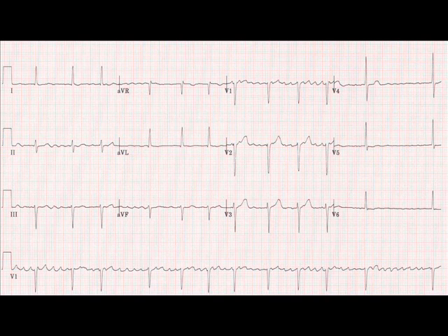And remember, if they're in sinus rhythm in one lead, they'll be in sinus rhythm across the rest of the recording. Well, to answer that, we have a look at the rhythm strip printed along the bottom of the ECG or EKG, and that's because it will give you the maximum number of complexes and therefore a great deal of data to work with. But you'll notice here that the rhythm strip is V1, and that's quite unusual. It's normally lead 2. That's because lead 2 is a very positive or upright lead, and therefore arrhythmias appear more familiar. So I'm going to look at the rhythm strip, but also I'm going to look at lead 2.